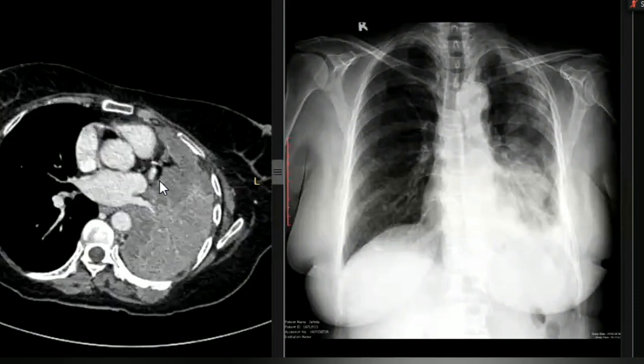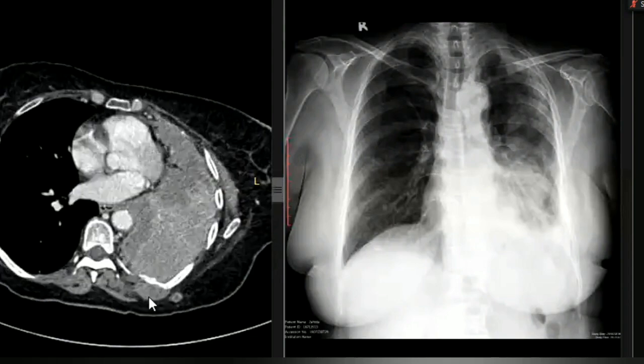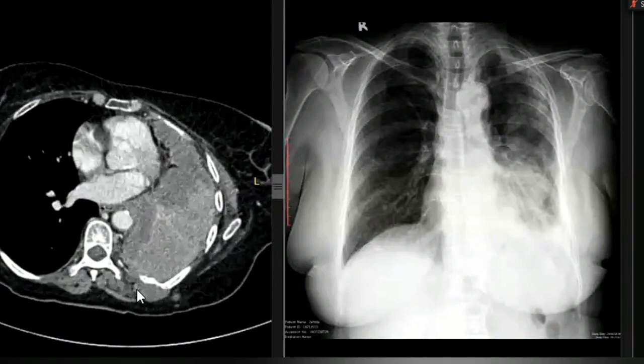Also, you will share with the examiner that I don't see calcifications, but I can see that a soft tissue mass is extending posteriorly across the wall. They will show you, even in FCPS, one or two targeted images on soft tissue window with such masses, so they would expect you to pick this finding and this nodule as well. They would expect you to find the mets which were present on the right side. So the rib, look at this, the shape of the rib. Even if I don't go to the bone windows, it was visible.